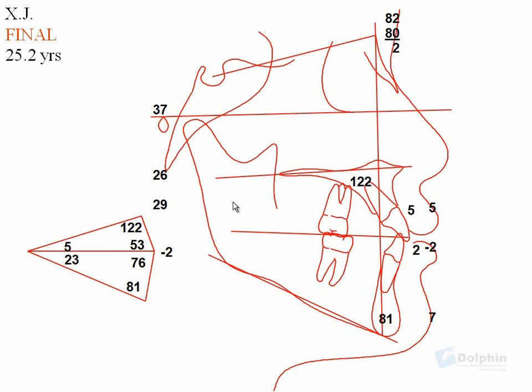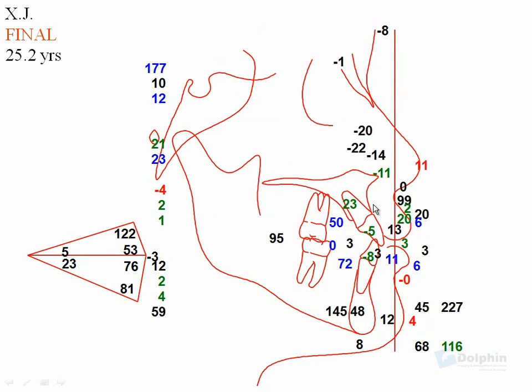Here is her final traditional cephalometric X-ray, showing upper incisor slightly compensated forward and lower incisor slightly upright. Still some dental compensation present in the case. And here you see her Arnett analysis with some fullness to the upper lip. Upper incisor is at 5 millimeters behind true vertical line, so there's a little fullness there, but I think overall a better surgical decision for the patient.